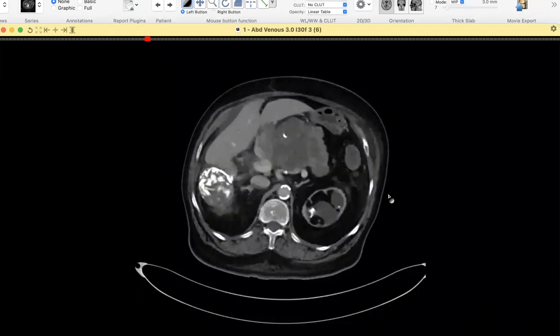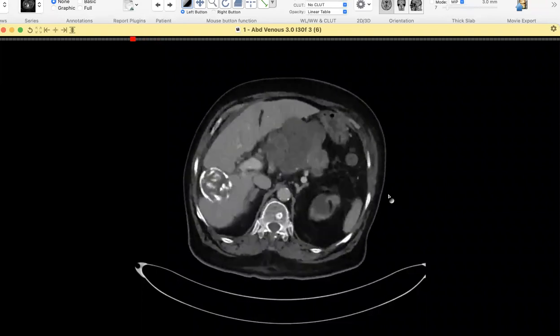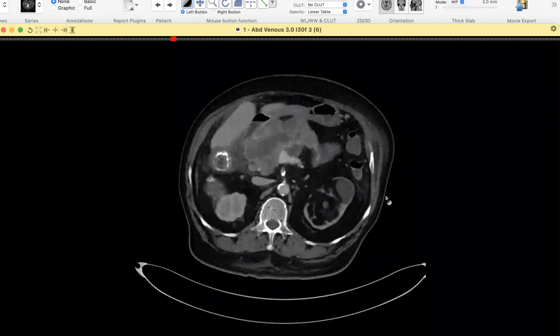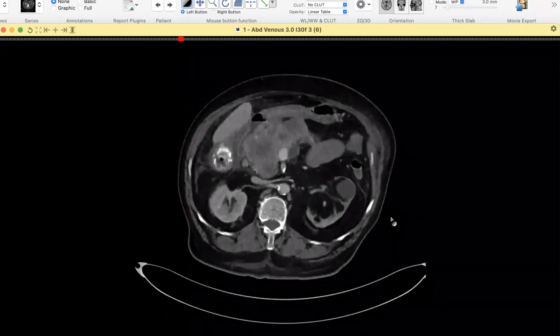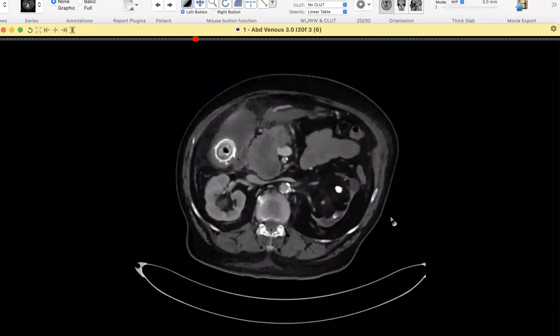So I would relay all these findings to the referring clinician to be discussed. What finding over here is the most concerning for the clinical presentation and for the clinician? Because this patient has multiple findings, what should he act upon first? First comes the gallbladder with a huge calcification, and because the patient has right hypochondrial pain, it could cause some symptoms.